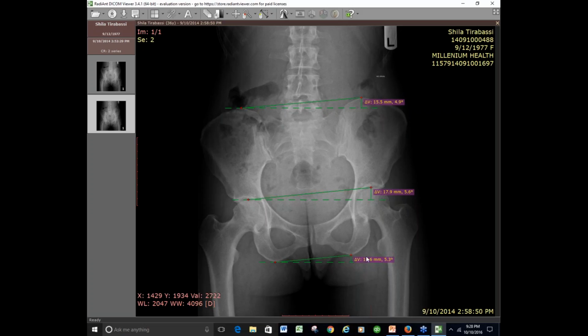What we want to look at though is, and this is actually a little bit off, so let me move that just a little bit, because this will make it easier for us. Okay, so 15.5 and 10.1. So let's say that's a 5.5 would have been. But look over here, 5 degrees and 5.1 degrees.